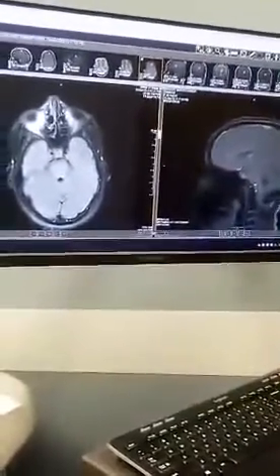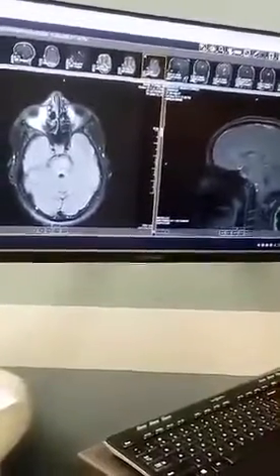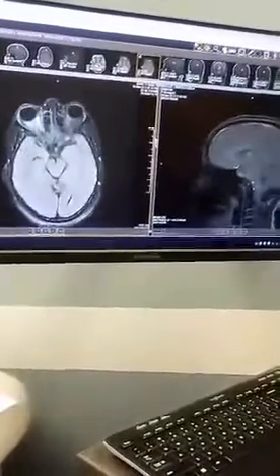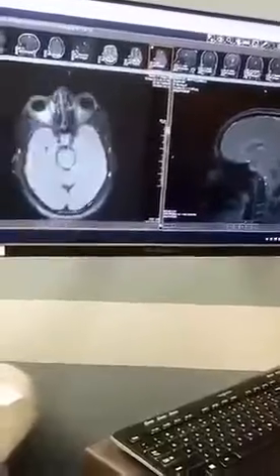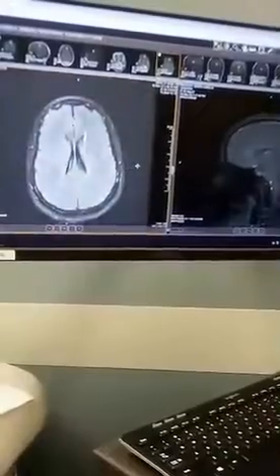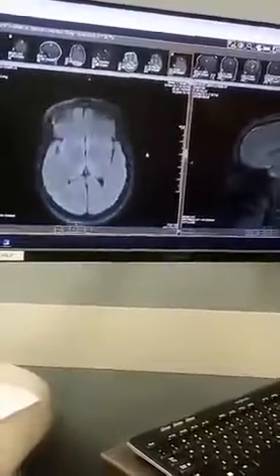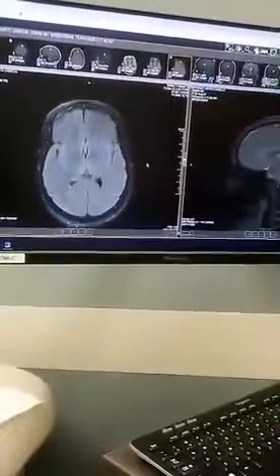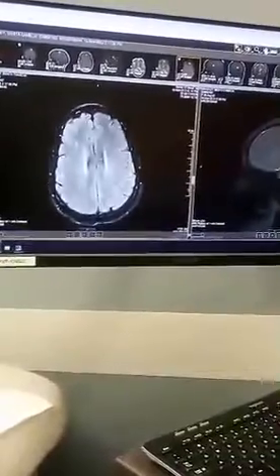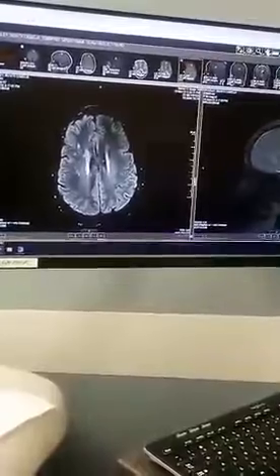At some point, as I put more and more pressure on it, the water will stop coming out of the end of the hose. And if the blood stops flowing through here, that's when we have a problem and risk of another stroke. So this picture is to show you the areas of damage. Now, when all these occurred I can't really tell you. But let's see if I can clear it. There we go. So the white areas here are areas of damage.